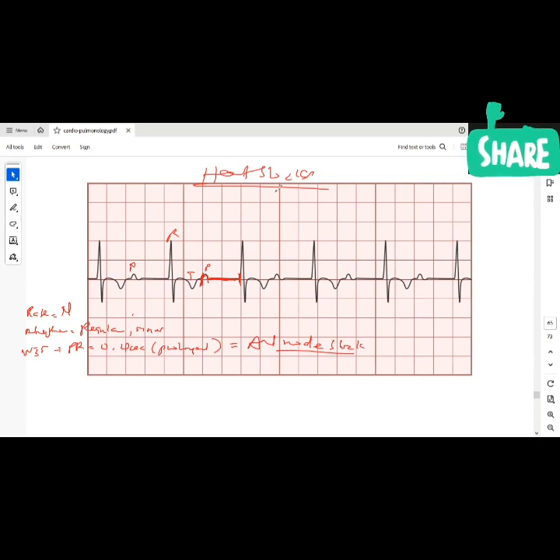So is there anything else wrong with this ECG? The QRS complex, the QT interval, is there anything else wrong? The inverted T wave. Right, so the T wave is inverted. I'm not sure which lead we're looking at here, but it might be just due to position. If it's like aVR or V1, because of their position, sometimes the T wave can be inverted because they are opposite to the ventricle. So let's assume that's normal here. The only abnormality here, let's say, is the prolonged PR interval.